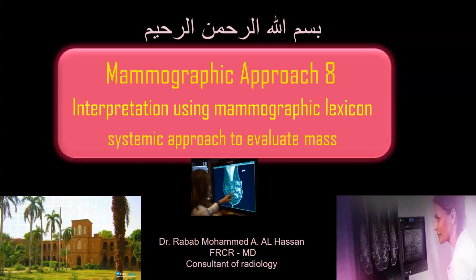We continue our series of breast lectures, Mammographic Approach, number 8. Today we are going to discuss the evaluation of mammographic masses systematically using the mammographic lexicons.